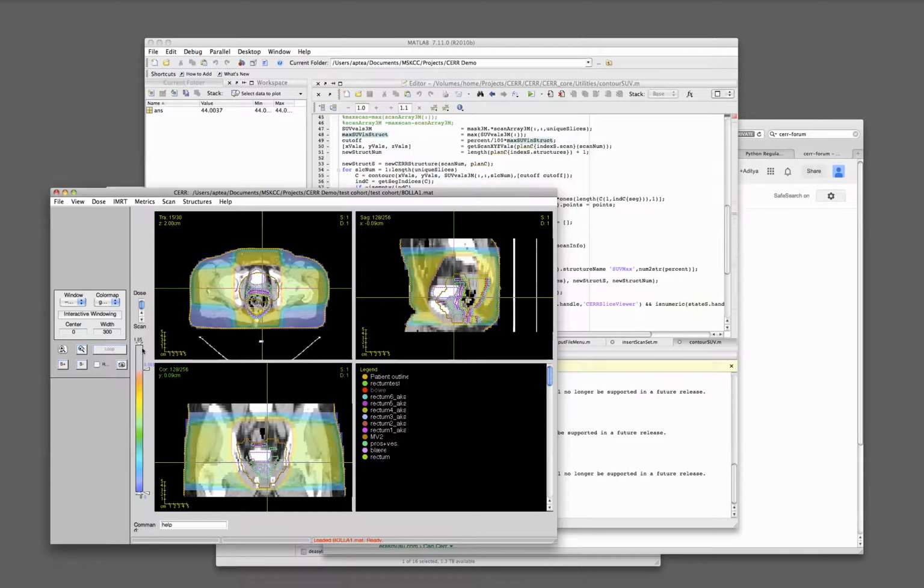Now if you drag this upper triangle down here, this will still show me dose between 0 and 0.866, but dose above 0.64 will all be shown with this red color. So you could play with various dose display options from this color bar.